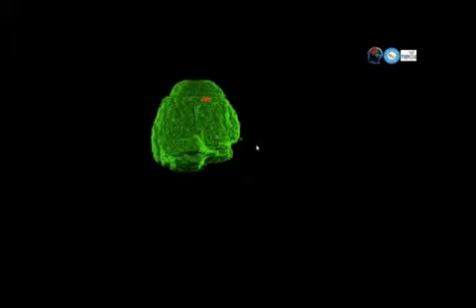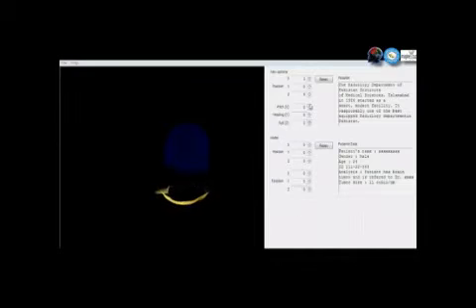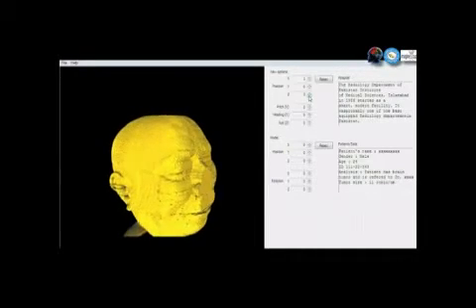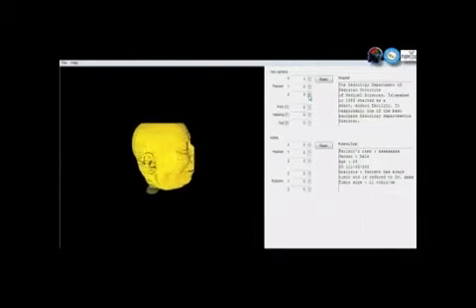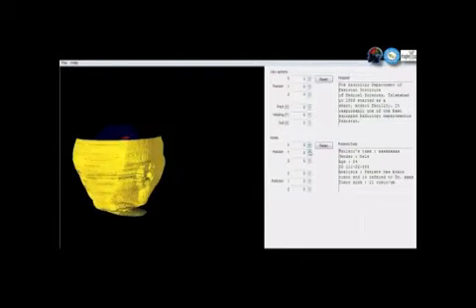This allows the radiologist to view an almost real-time digital map of a patient's brain. Brain Inspector also allows the radiologist to virtually slice the brain into sections. The developed software is fast, does not require any pre-processing beyond standard MRI analysis, and is flexible enough to be incorporated into existing complex medical visualization systems.